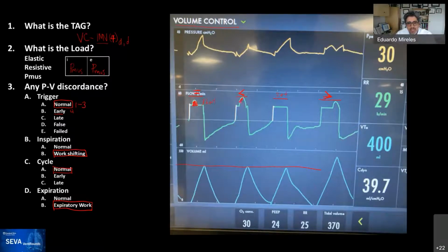But in this one, it's much bigger. So it shortens the inspiratory time even more to keep the tidal volume within range. The engineers here were really thinking about how to keep the tidal volume in range. However, on the fourth breath, the patient has this early trigger, as Samit recognized. So this is a machine trigger, and then there's Pmus, and the patient actually generates all this extra flow, and you can see how the tidal volume went above what was set.